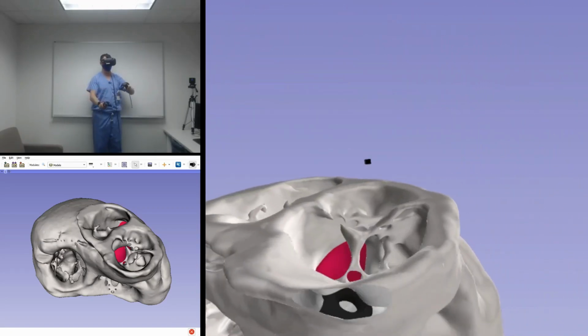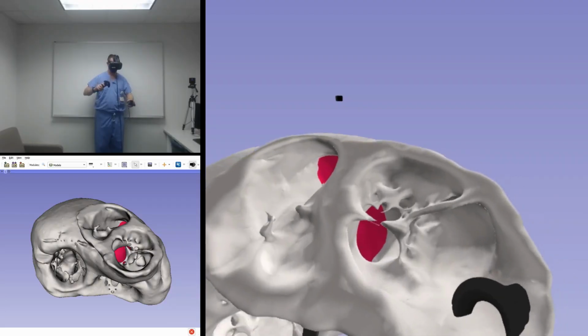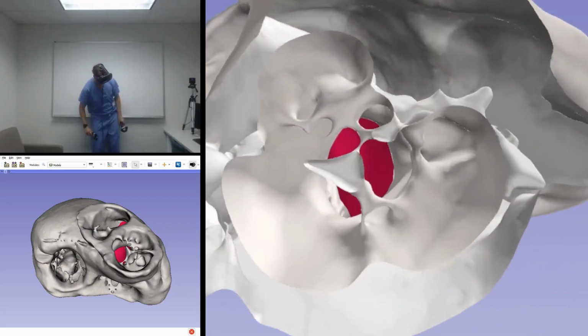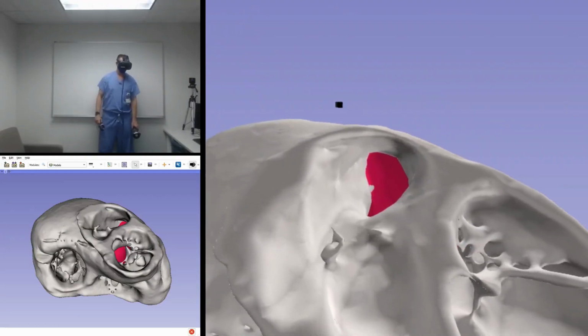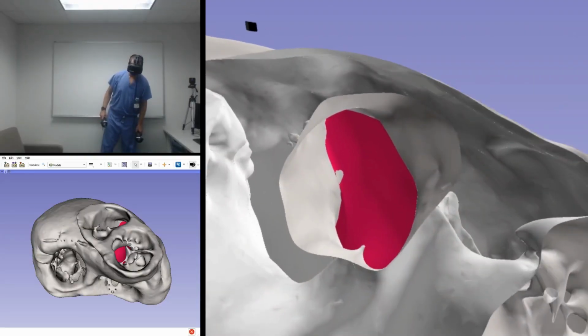And finally, look down through the aorta and then the pulmonary artery down at the baffle patch.